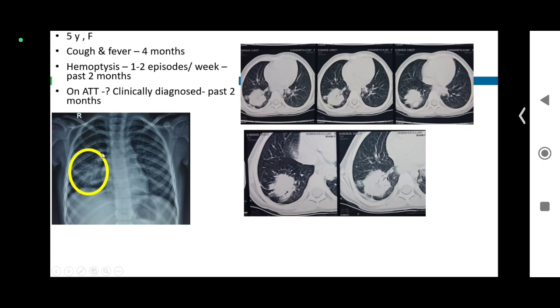This is how the aspergilloma will look in CT. With any fungal infection, many times the textbooks will give you fungal ball. This is a round shadow. This will not be in the center. Usually it will be in the periphery, close to the chest cavity, close to the rib cage. And most of the time it will be rounded, unless it is liquefied.